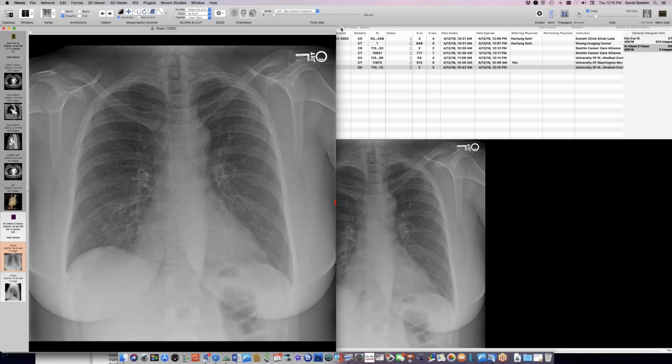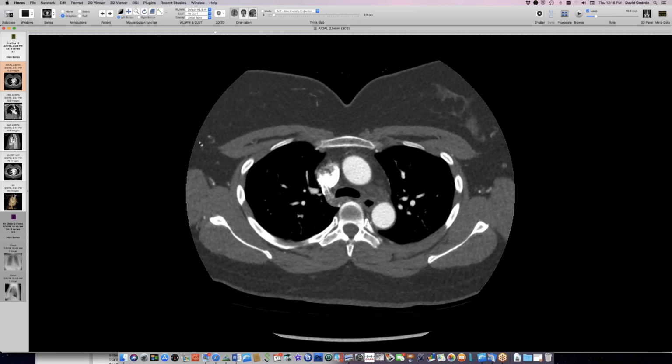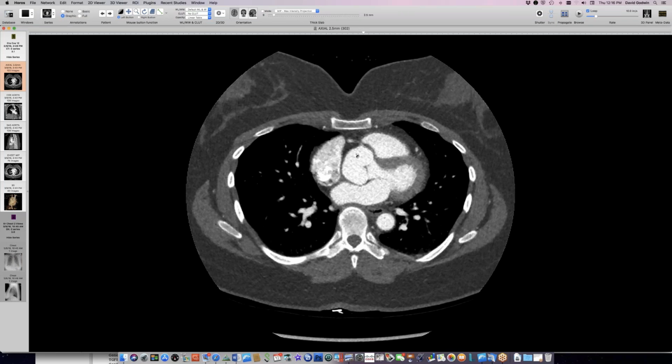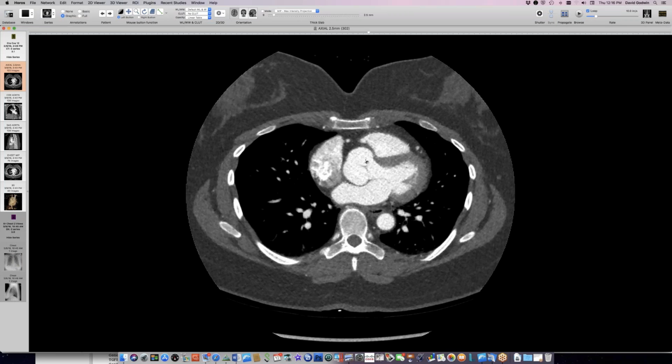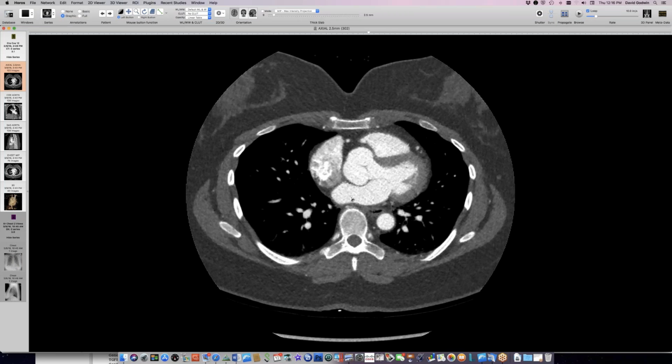This woman has a pretty normal chest radiograph. She's 36 years old and her aorta looks normal. But let me show you her CT. She has this modest dilation of her ascending aorta, and she has quite a bit of dilation down here at the level of the sinuses. They measured 4 centimeters on their special measurements that they do across this, and this had increased slightly. She'd been followed for a couple of years because she carried a diagnosis of Marfan syndrome.